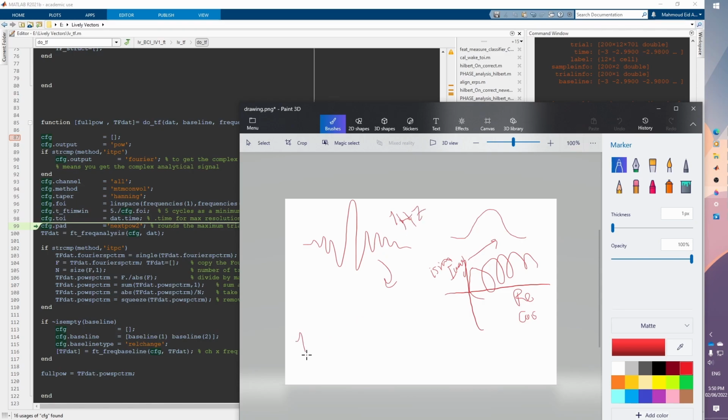So we can then take our EEG signal, which might look like this, and we can apply a sliding window approach. What we mean by this is that I'm going to take this wavelet and put it here, and I'm going to multiply element-wise the length of the wavelet with my data, and then I'm going to sum all of this and I will have a new value.